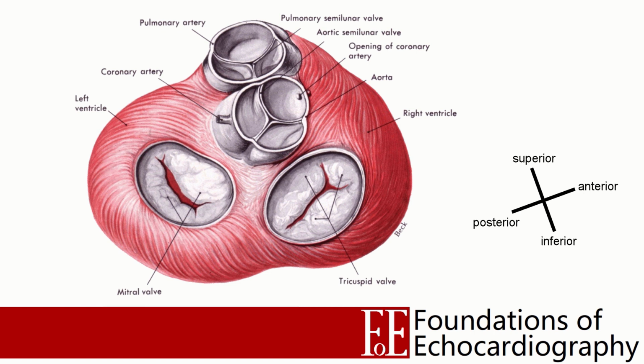Okay, so this is probably a good time to turn our attention to the right heart and the right heart valves. Now in the level 1 syllabus, not as much attention is given to the right heart valves as to the aortic and mitral, and this is because lesions of these valves are much less likely to be hemodynamically significant in the context of an acutely unwell patient. Nevertheless, we do see these valves during our study, so we'll spend just a few moments revising their anatomy, how they appear on echo, and what assessment we need to make.